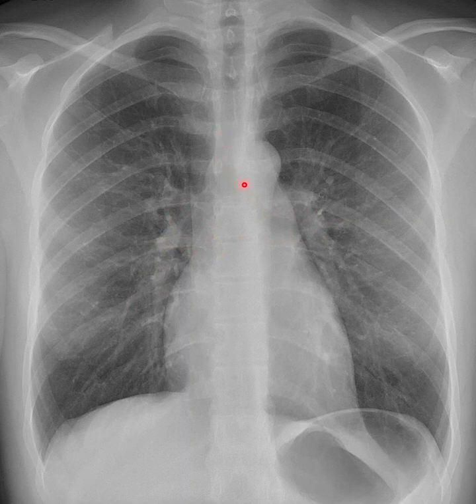And then another thing that's very, very important with our chest x-rays is that we want to try, if the patient can, if they're standing up for a PA chest x-ray, if they're sitting up in a stretcher, or if they're in their hospital bed, if they can roll their shoulders forward, we would ask them to do that because what we don't want is what we're seeing here in this x-ray.